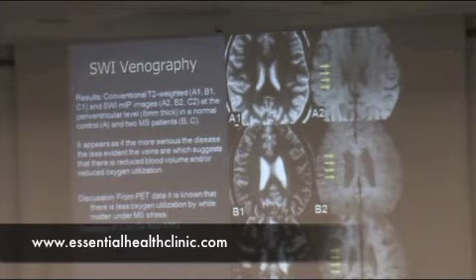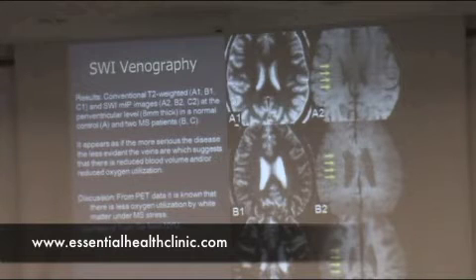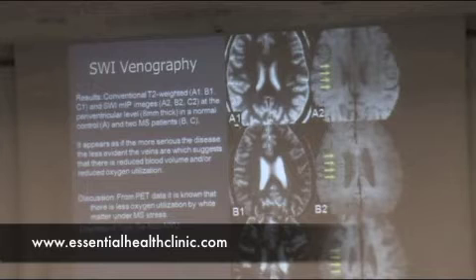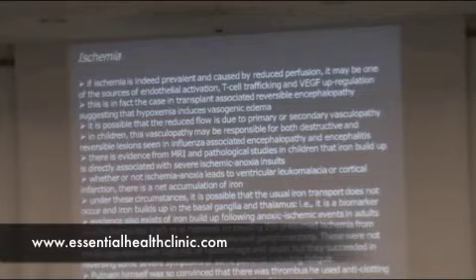But what is probably happening is that there is some contraction of these veins, or some reduction in the local cerebral blood volume. And of course, if I reduce the blood volume, I will see this effect much less, just like we're seeing here. And that all, again, matches the concept of reduced perfusion, reduced CBV for MS.